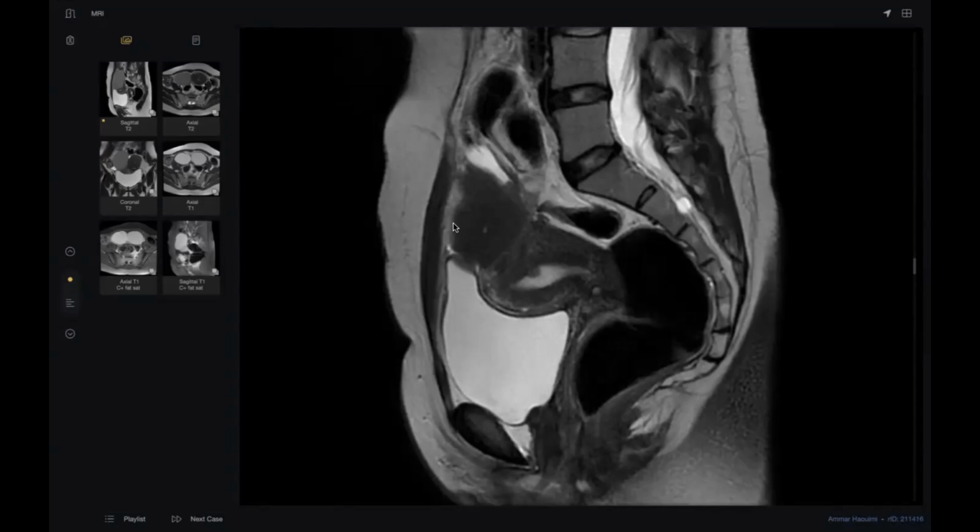Sir, this is a case of bilateral endometriotic cysts with septate uterus. This is a concern for infertility in this case. I will suggest a gynecological referral, and subsequent surgery may be indicated for the septate uterus.